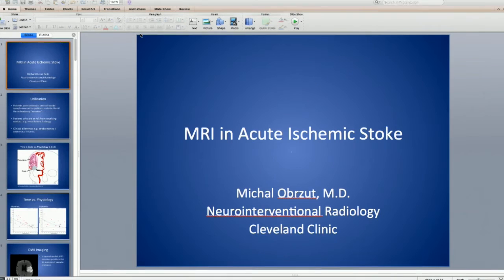Okay. So in conclusion, MRI is very helpful because it is pretty much the best modality able to pick out the tissue that has already infarcted. The tissue that's at risk, you get that from the patient's clinical exam. And this has been validated recently. I was very excited. I've been doing this protocol for many, many years. However, I was very excited that this was validated recently in the DAWN trial, which basically shows that you should be intervening on patients up to 24 hours from symptom onset if, when they present, their core is less than 50 cc's. I would go even further than that.